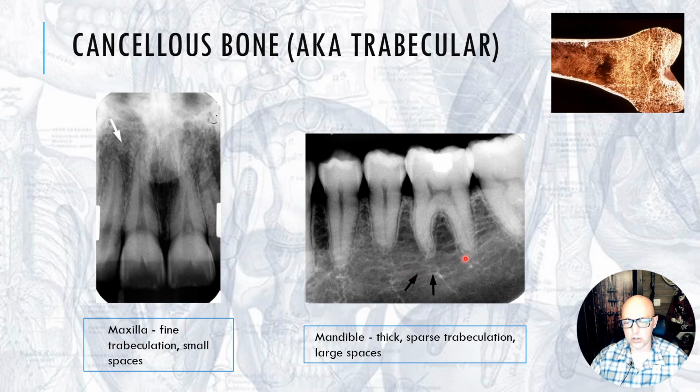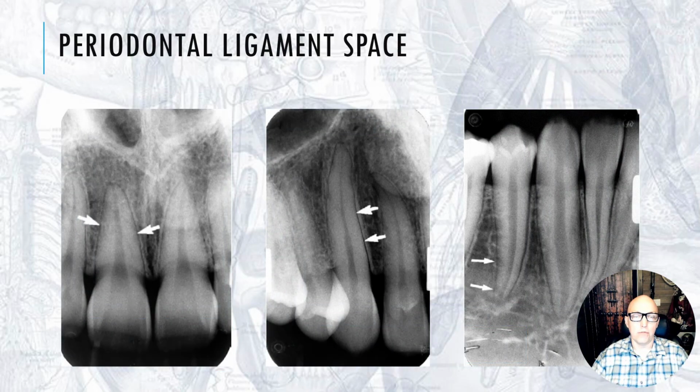And there's a lot of variation in the mandible, especially in the body of the mandible. Here I see a lot of times where it just looks really radiolucent, and that's just anatomical variation because I don't really know the reason. Some cases it may be osteoporosis, but some people just don't have a lot of dense trabecular pattern in that area.